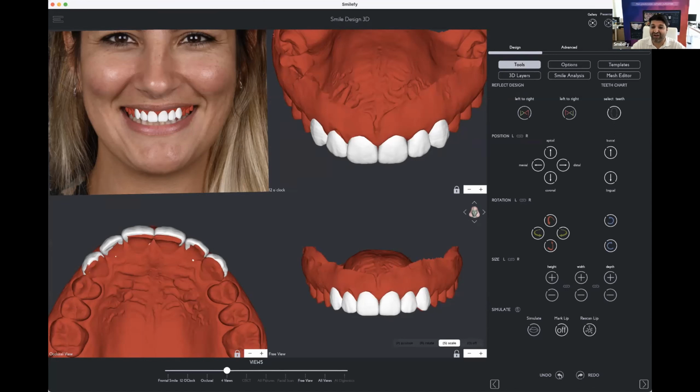I think we have 5 steps. I integrated 5 steps to keep the memory usage low, right? But now, whatever you do, in case you say, okay, I'm gonna try to change the rotation, I don't like it very much, undo, you get the initial position back. Okay, thank you very much. That was your feedback. Here is your feature, undo and redo.